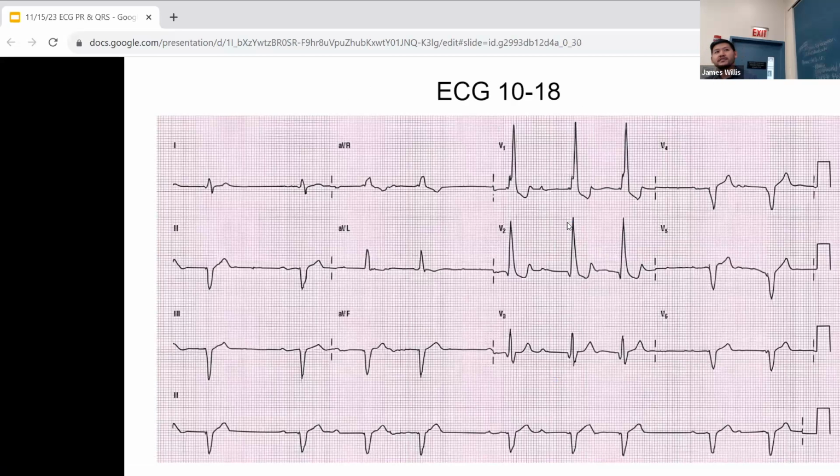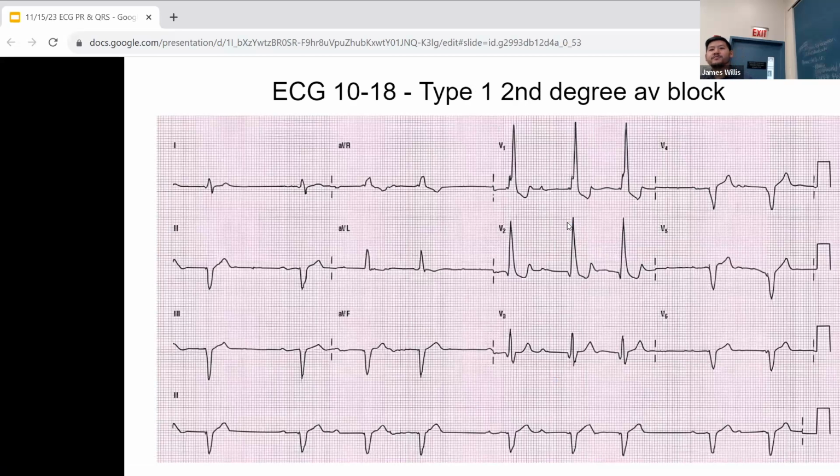One of the things you would worry about here, especially if the patient came in with near syncope or syncope, is you have a very left axis, or at least it's down in there. And then you have what looks like a right bundle branch. And then you have something messing with the P wave, either first degree or just a Mobitz type 1. You always have to worry, are they going to go into trifascicular block on you? I would worry about this kind of patient with all those different things here, if they came in with syncope or pre-syncope. Definitely.